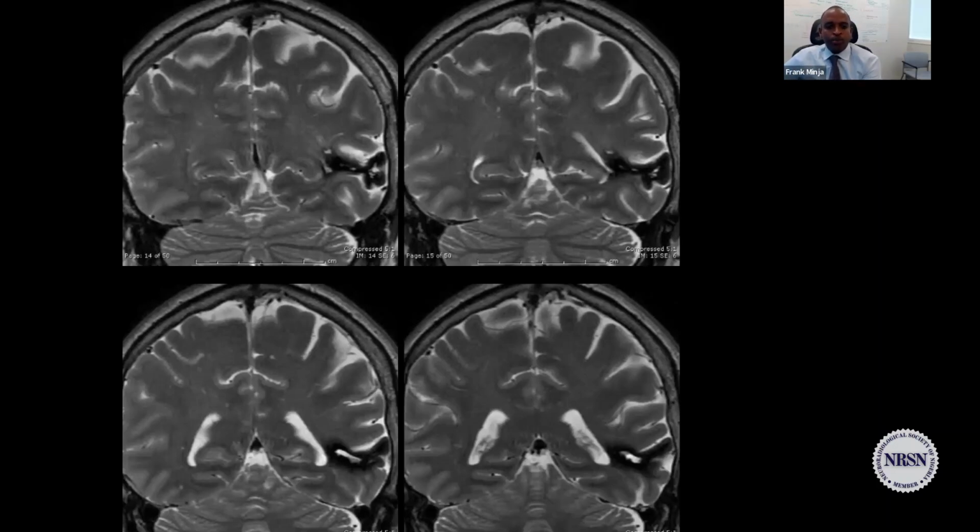your patients will present with these lesions. The typical presentation is going to be seizures. So whenever patients have seizures and you have this kind of lesion, really think about a cavernous venous malformation. I show this one a little bit unusual.